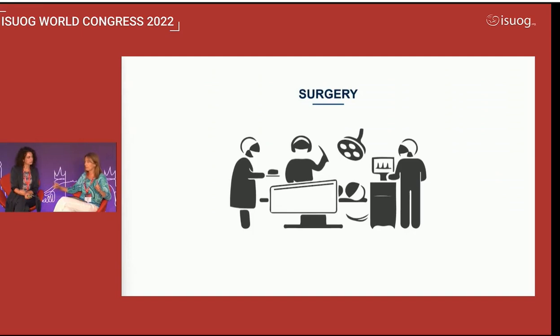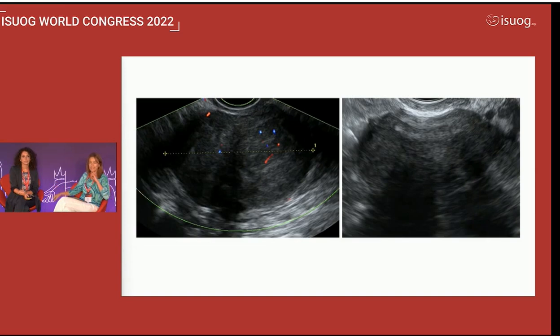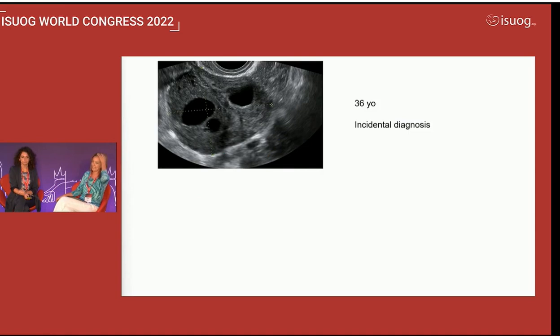Okay, good. Shall we ask the audience? Benign or malignant? Are you with me? Benign. Yes. So no surprise, confirmed for you. It was an ovarian fibroma. It was confirmed. Okay, done.